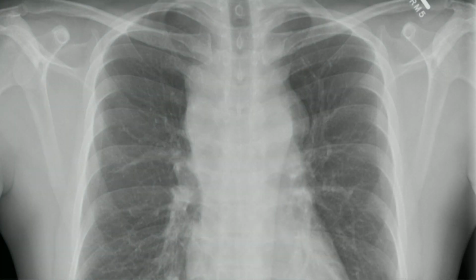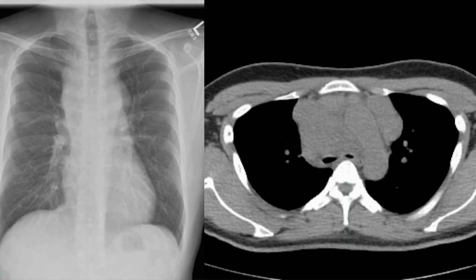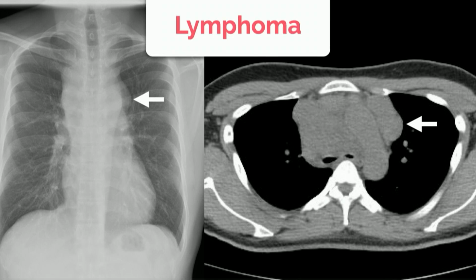So this patient has a widened superior mediastinum, but of note, there's also displacement of the AP interface. And this turned out to be a result of lymph nodes in a patient that had a diagnosis of lymphoma.